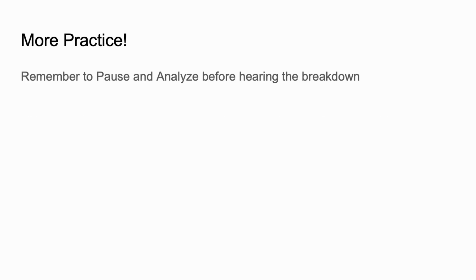Now that we've covered our key concepts, let's go through a few more practice EKGs. Really try to pause and analyze these EKGs, as we'll be focusing mainly on the key findings and breaking them down.